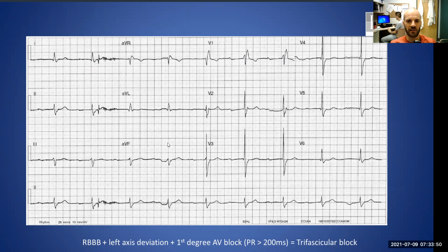Okay, so it's a progressive. These patterns are progressively showing more and more disease of the conducting system. If this carries on, if it gets any worse than this, it's going to progress to complete AV block. So those are the sorts of patterns that we get if we've got damage to the conducting system affecting the right or the left bundle branches.